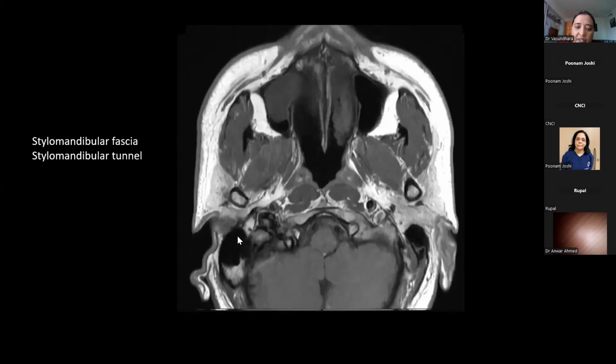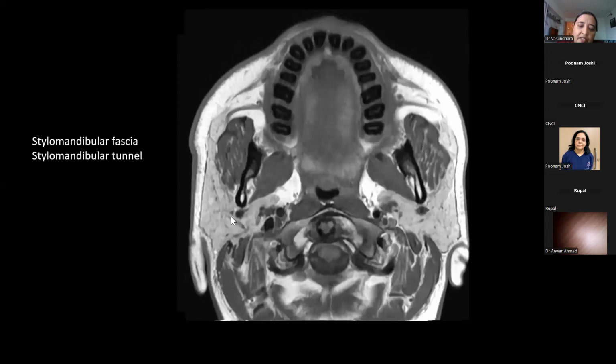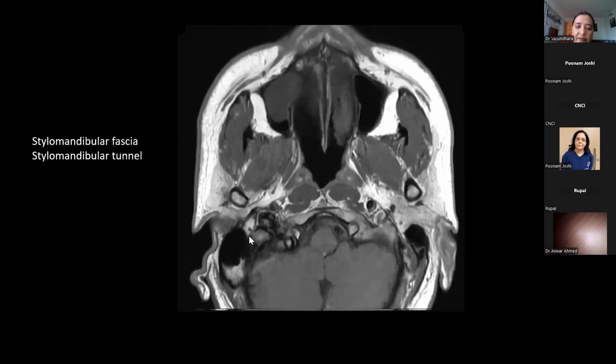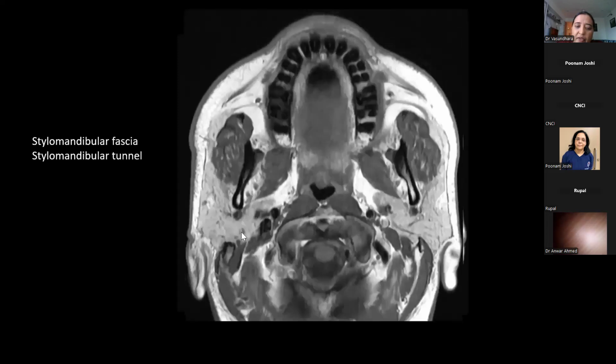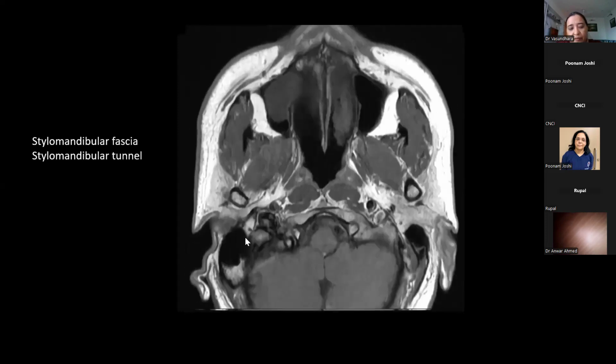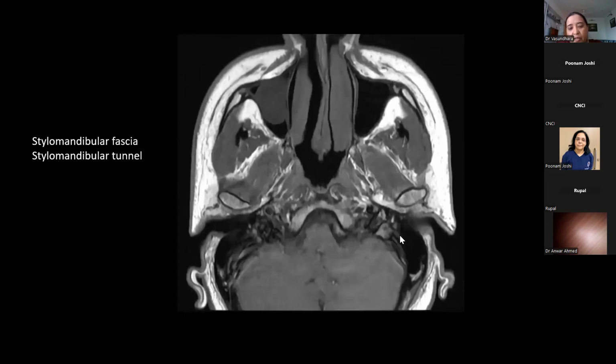See, this is mastoid tip coming medially. I see this dot. I know this is my facial nerve. Trace your nerve, and you will come up till here. After here, it starts branching, and those branches become difficult. Only when there is a thick perineural, we very well understand these. So now you see any image, go back, go forth, you will see these nerves. Okay. If you find any, now forget about the temporal part. If you find any enhancement over here, keep looking up on your post-contrast sequence to see whether your enhancement is going up in the temporal part.